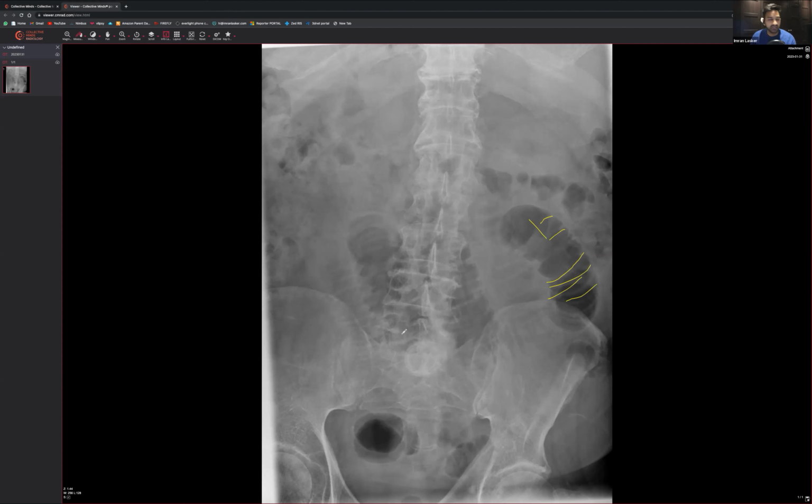That's what we're looking at. On top of that, what we can see is this radiopaque density sitting within the central abdomen over here. You can also see it's got layers. Those are layers, right? That doesn't look quite right. So someone has said this could be gallstone ileus.